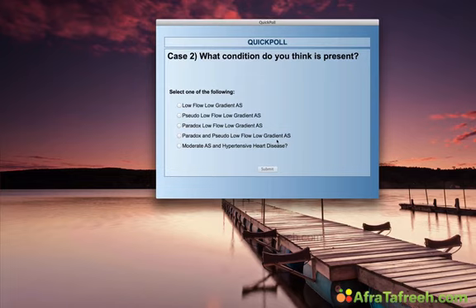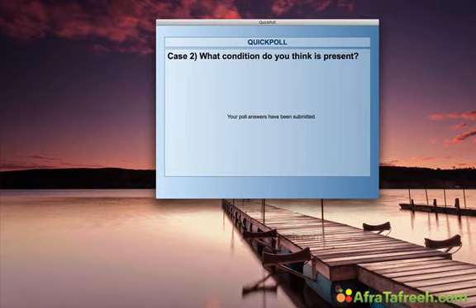I know I'm confusing you here, and it is sometimes very confusing, but I will show you later how we can easily separate these various conditions from each other. And the last question is, do you think that aortic stenosis is not severe at all and that it's only moderate, and that the patient has hypertensive heart disease and that that is actually his main problem?